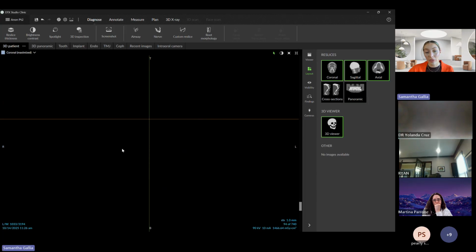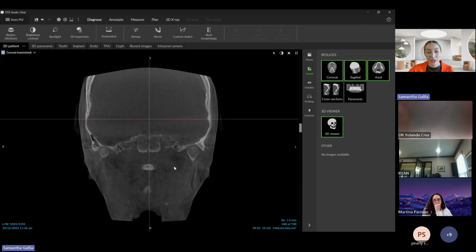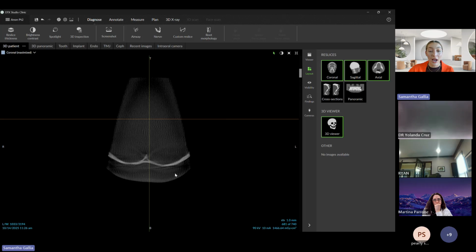So I go from the anterior portion of the scan all the way through to the posterior portion. And I know it's really easy, this is a note, I know it's really easy when you get back here to just breeze by it and not to go all the way through.